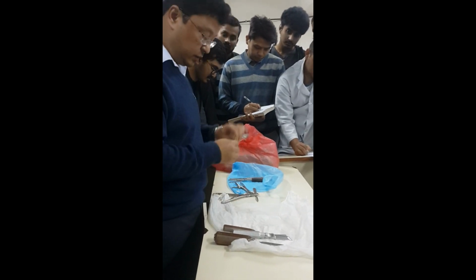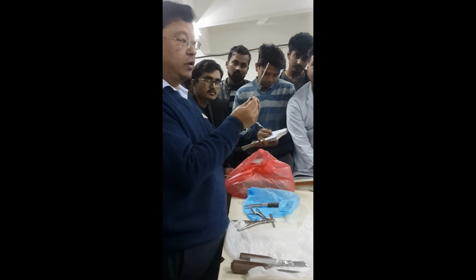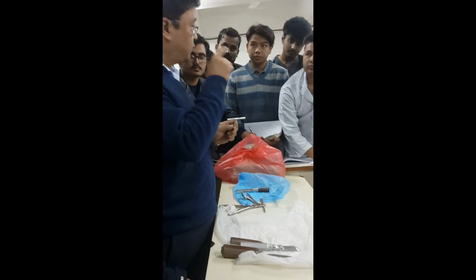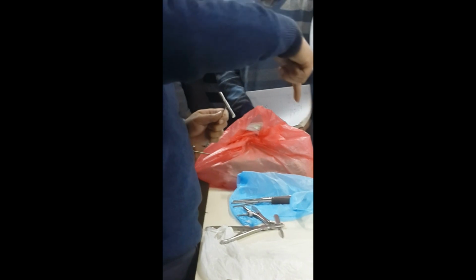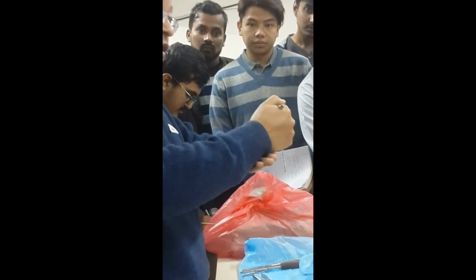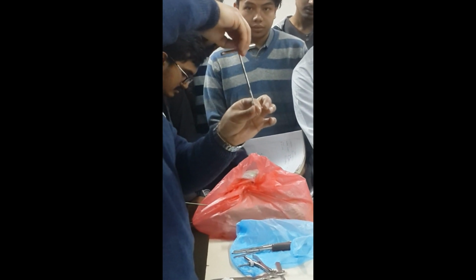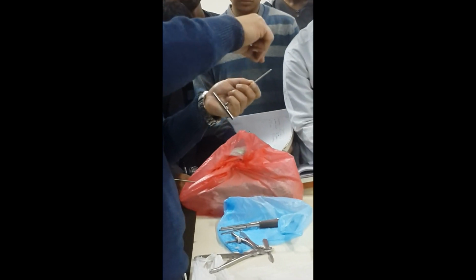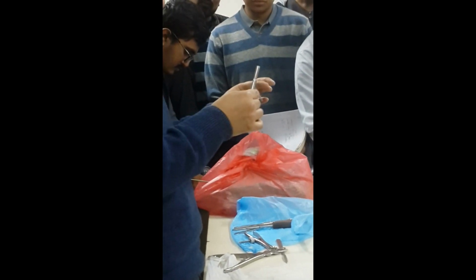Then this is a tap. We have not brought the drill bit. The drill bit is used for making a hole in the bone to put a plate. First you drill. The drill will be something like this. There will be no handle, right? There will be serrations without a handle. You just drill a hole. After that, you use this tap. It is for making a thread. There are threads here, and it will make a thread in the bone. And after that, you put a screw.